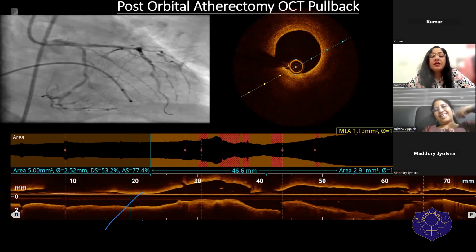I understand, but cost upfront, procedure. With such extensive calcified nodules, I thought a combination, or at least an NC balloon should be used, a cutting balloon or something, some high pressure, or use NC at very high pressures to break the base of the nodule. Yes, absolutely. So let's look at the story and see how it unfolds.